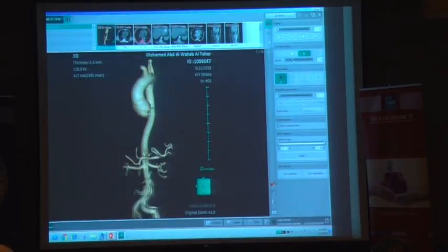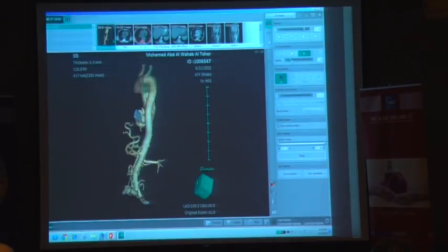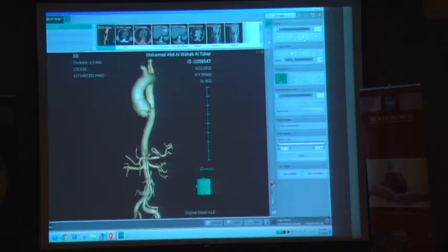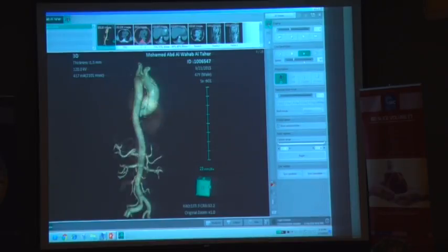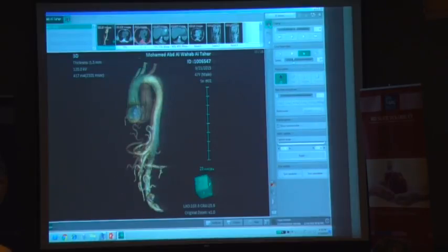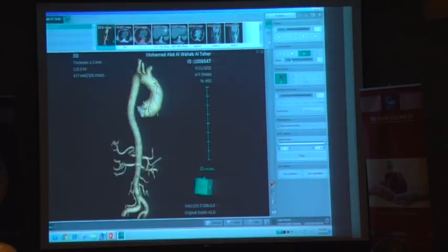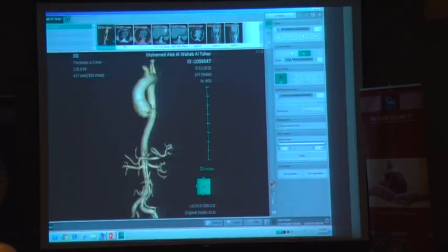Yes. Excellent. Who said aortic dissection? Okay, there is a cardiology group here, I think. So there is aortic dissection, but I would really like to give the gift if you get the full diagnosis. So I will show you the set of images after injection of contrast. We'll go from down upwards. Maybe we can do it faster.